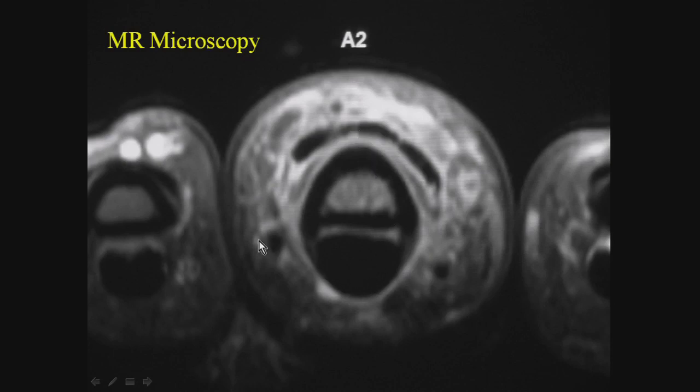These little flow voids are the little digital neurovascular bundles, and this is the place where little neurogenic tumors are actually not unusual in the digits. It can be quite painful.